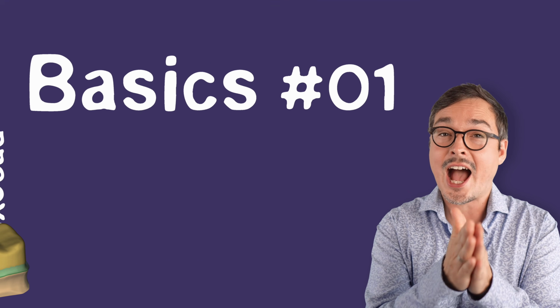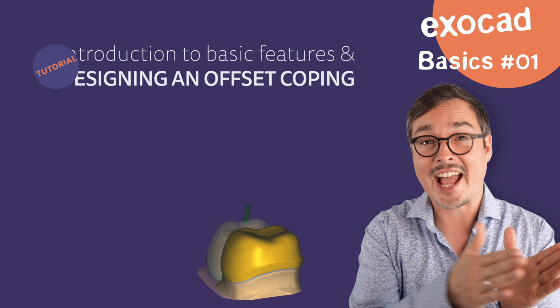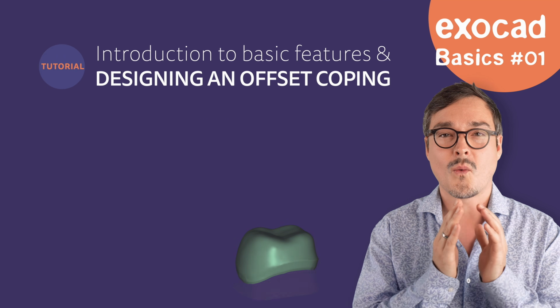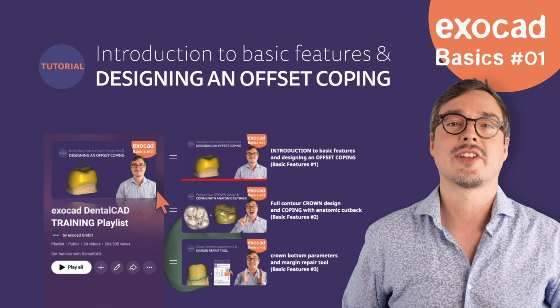Now you have learned how to set up a case from scratch and how to design an offset coping using exocad step-by-step workflows. We hope you're as excited as we are about the new skills you've learned today.